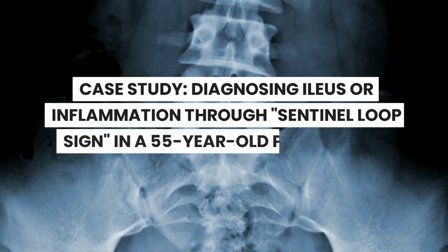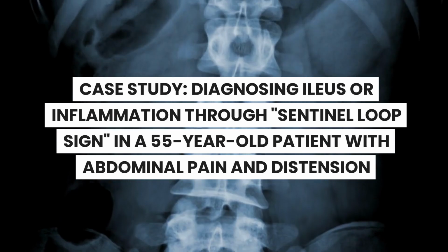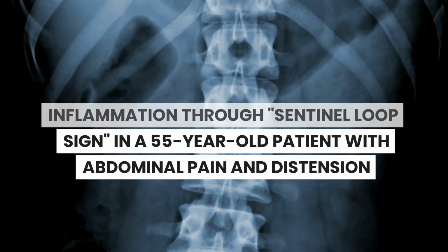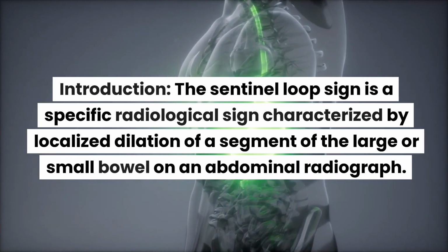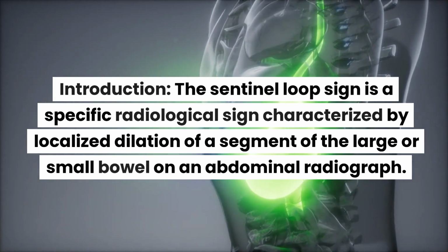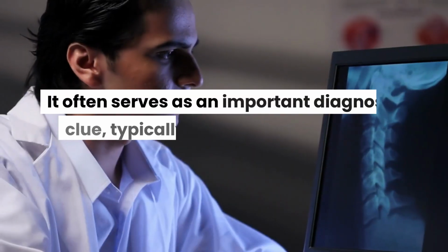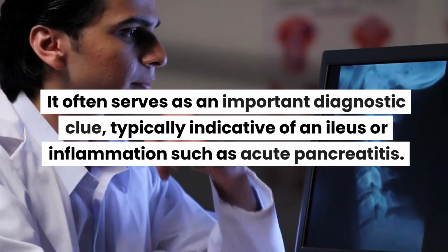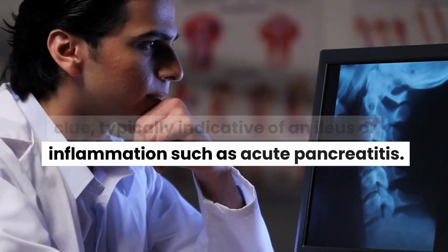Case study: Diagnosing Ileus OR inflammation through Sentinel Loop Sign in a 55-year-old patient with abdominal pain and distension. Introduction. The Sentinel Loop Sign is a specific radiological sign characterized by localized dilation of a segment of the large or small bowel on an abdominal radiograph. It often serves as an important diagnostic clue, typically indicative of an ileus or inflammation such as acute pancreatitis.